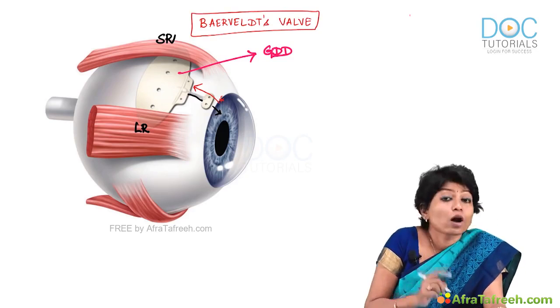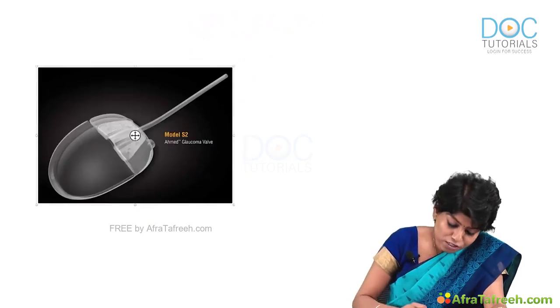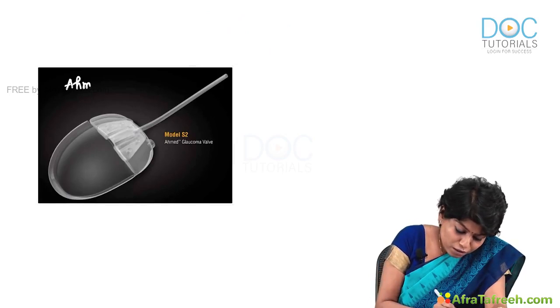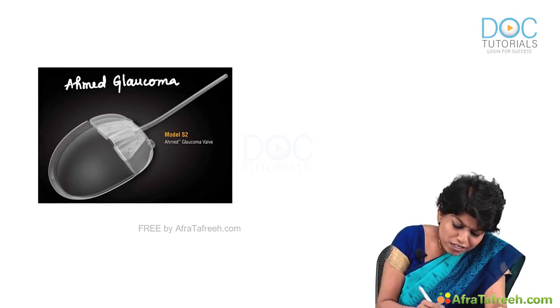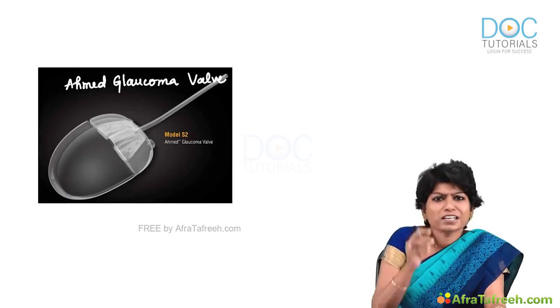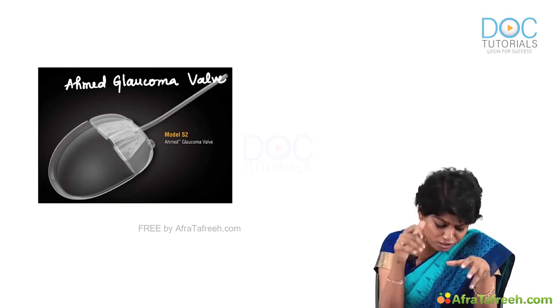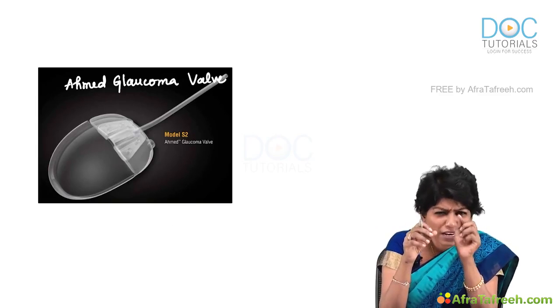But the most commonly used glaucoma valve is what we call the Ahmed glaucoma valve, okay. So, this is the Ahmed glaucoma valve. When you see it, how to identify it? It is going to look like a tiny mouse, no? The mouse that we use for our computers, it looks like that, but it's a very tiny one, okay.